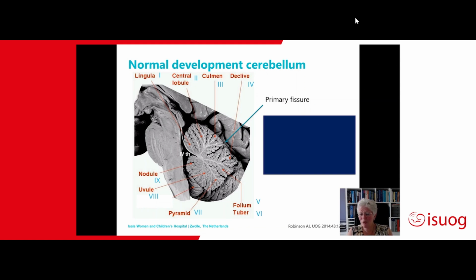And that's why we have sulcation and gyration, otherwise the brain wouldn't fit inside the skull. And we can see a little bit the same of the vermis, only here it's called foliation, like the leaves of a tree, which you can see over here.